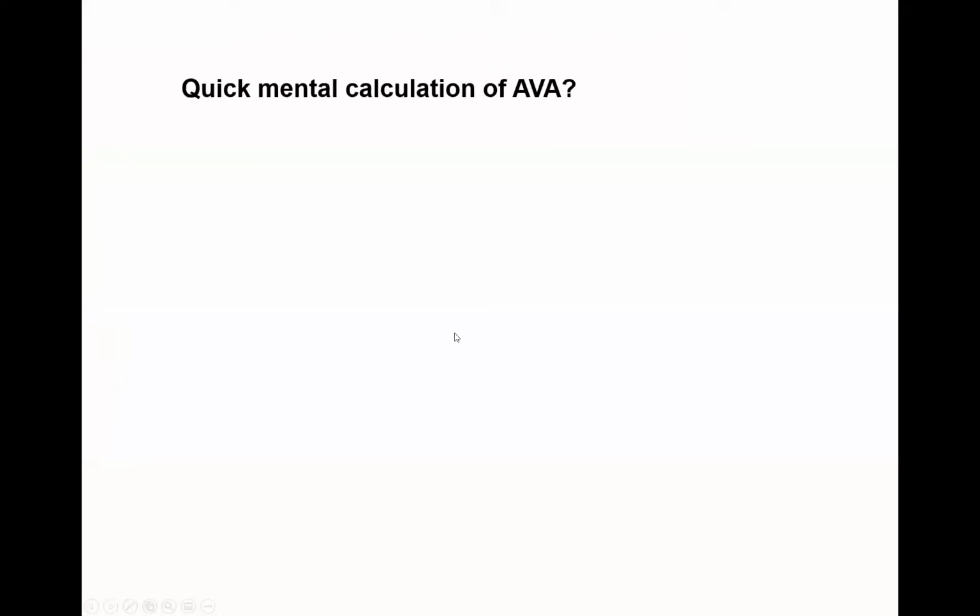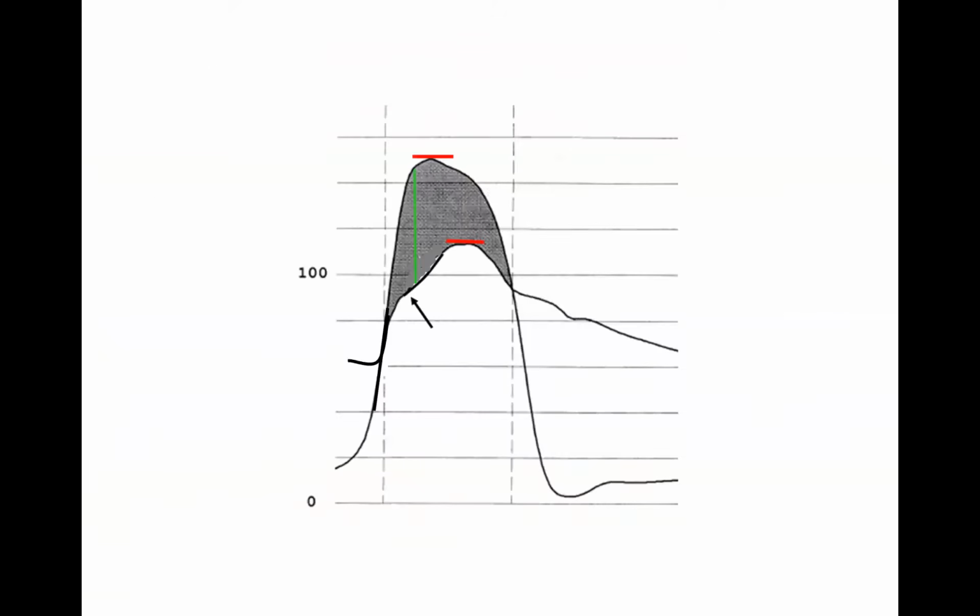But here I want to highlight for the newer fellows, I do want everybody to know, this is an important picture for you to memorize, okay? This is the aortic pressure, this is the LV pressure. There are 3 types of gradients, okay? There is the mean gradient, which traces the area in between, and it's an integral of every instantaneous gradient, averaged throughout systole.